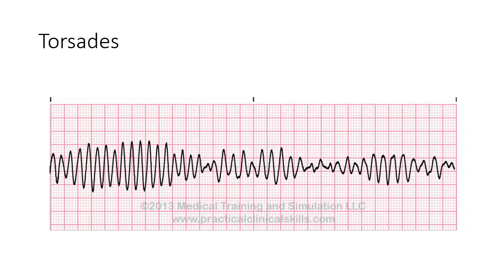Now, if you tell me this is VTAC, I will count it as incorrect, because this is a specific kind of VTAC that you need to be able to identify. Because we will treat this differently than run of the mill VTAC. So that's why I said, I want to say torsades, and I said stop. Don't talk yourself out of it. Good job. All right. No, Blake.